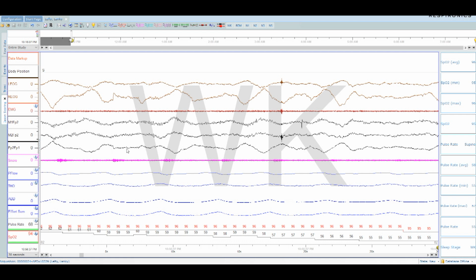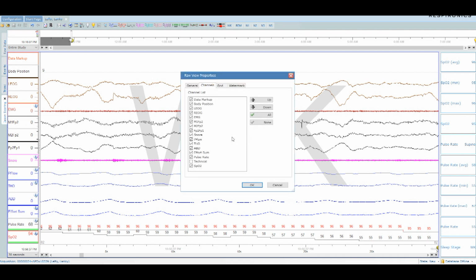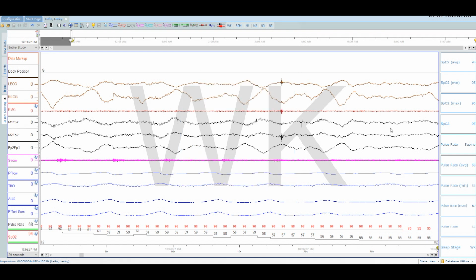FP1 and 2, this is a combined channel. I just use it so I have another channel to look at. Honestly, it's a little worthless. I might get rid of it. But let me pull up and see. Do I have? No, that's all I have. I'm stuck. So that's enough. That's good enough for me.